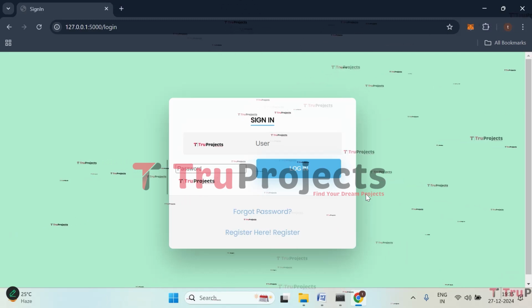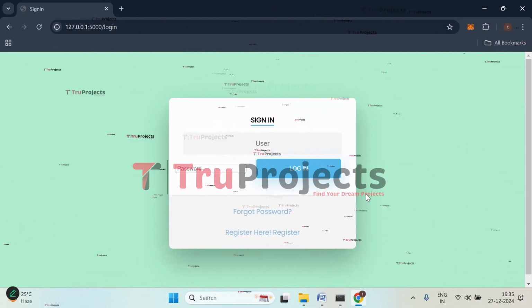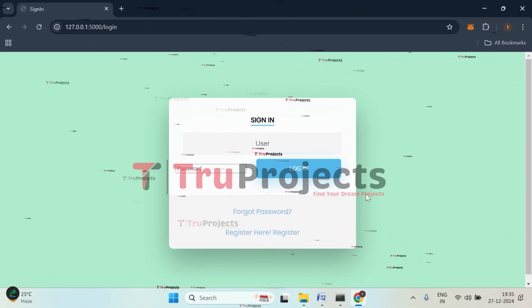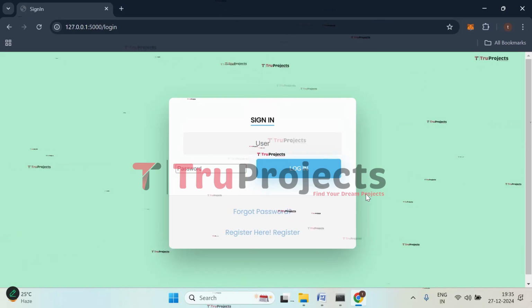In this way, just by uploading the teeth image to the system, it will detect where the disease is in the mouth and then it will detect which type of disease it is. So this is all about the project.